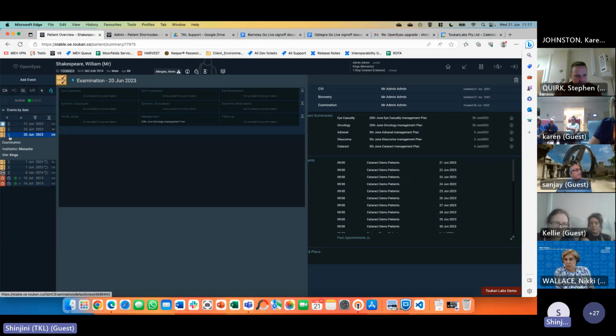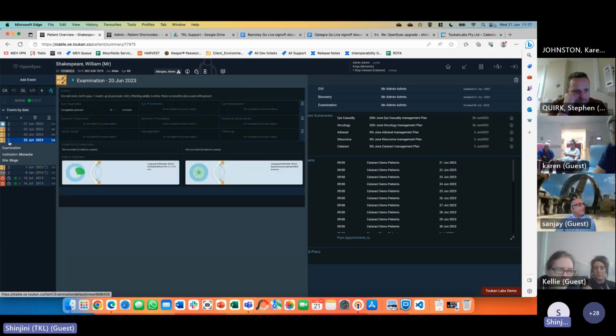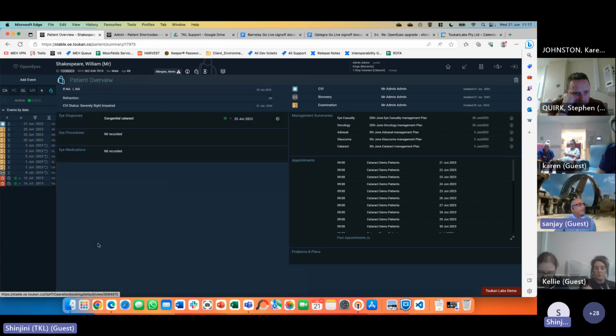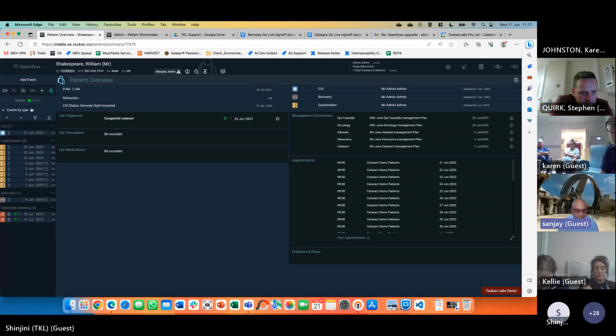Let me show you. This little eye icon here, I don't know if you can see it, but this is what you can hover and refresh over. You can have this panel set to events by date or events by subspecialty or events by type.